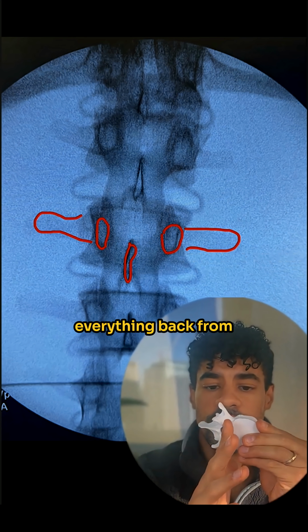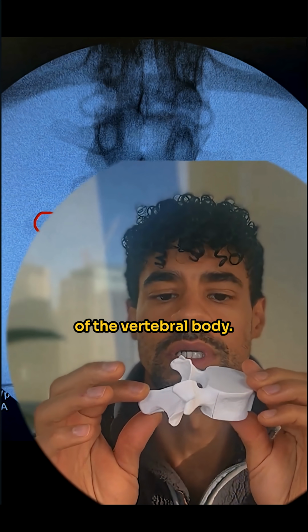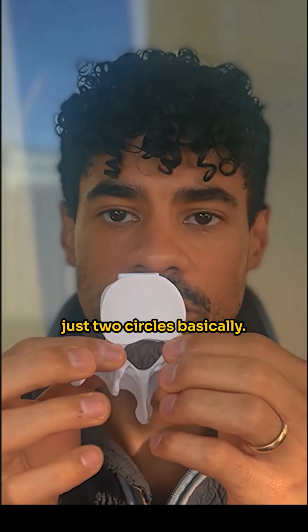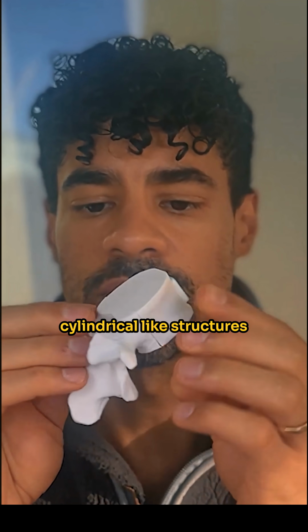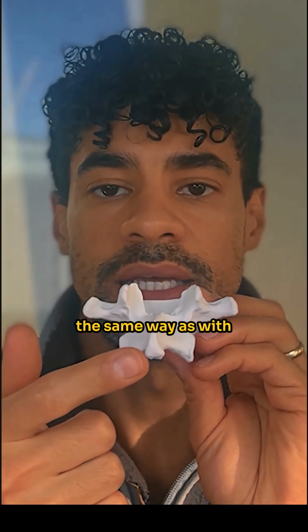So if you were to cut everything back from here backwards, this is namely the posterior arch of the vertebral body, or the vertebrae rather, then you'd be left with just two circles basically. And that's because you'd be cutting these cylindrical-like structures of the pedicle off, and then you'd be looking at it like this. Much the same way is with the spinous process.